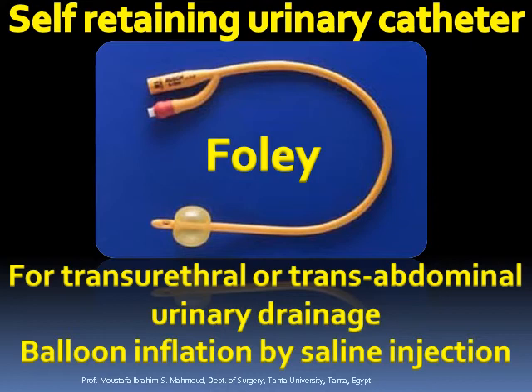It has a balloon to be inflated by saline injection after insertion to prevent its discharge or escape from the cavity it drains.